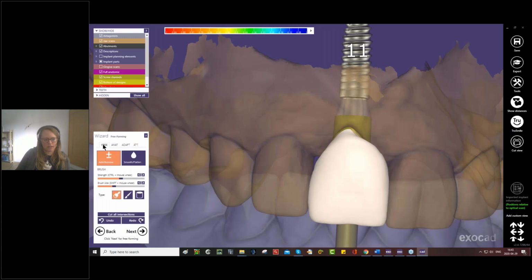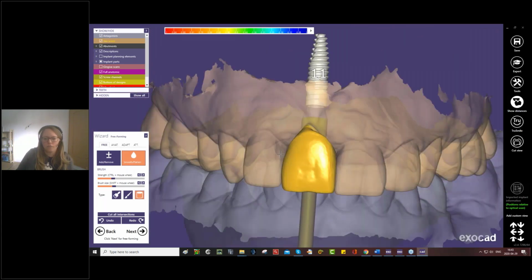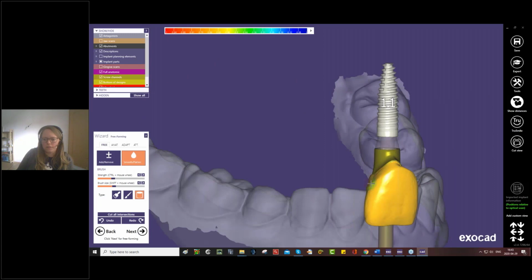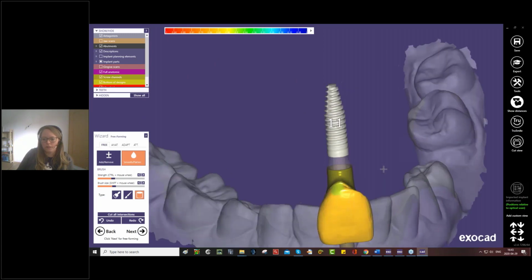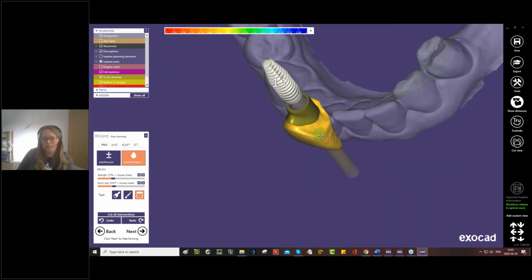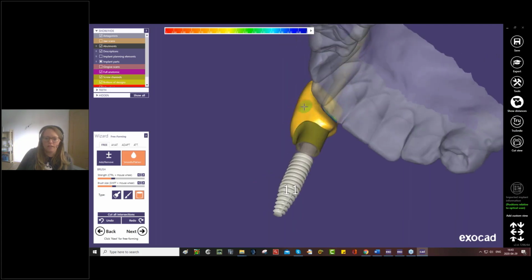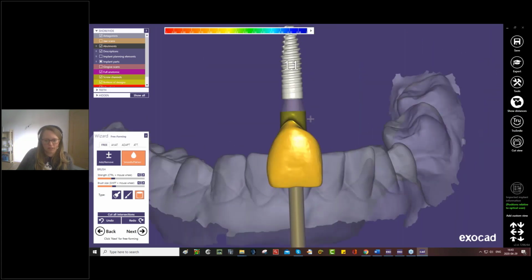At the end, I can do some freeforming. Let's turn off True Smile. I find it easier looking at it like this. And we can maybe move it a little bit here. Try to make it look a little bit nicer. I'm sure you guys listening can make a much nicer crown than this, but well. All right, let's just leave it at that.